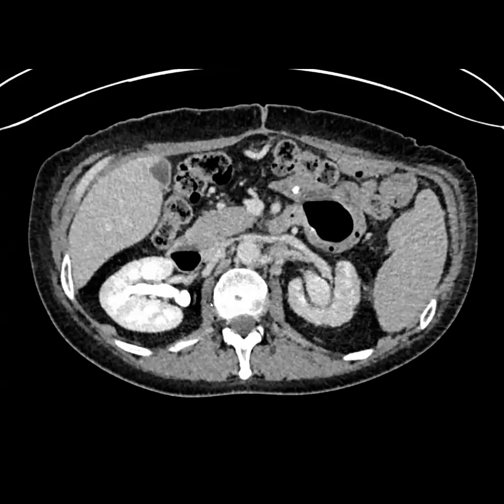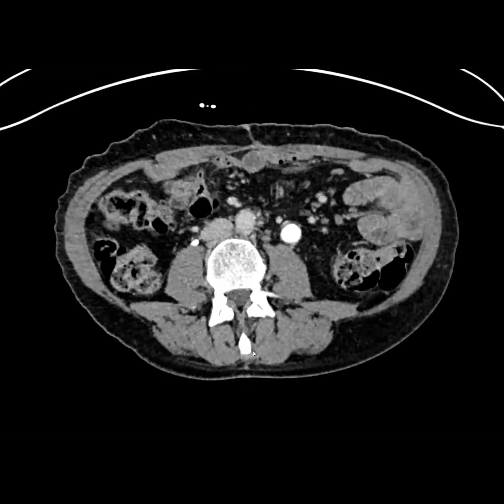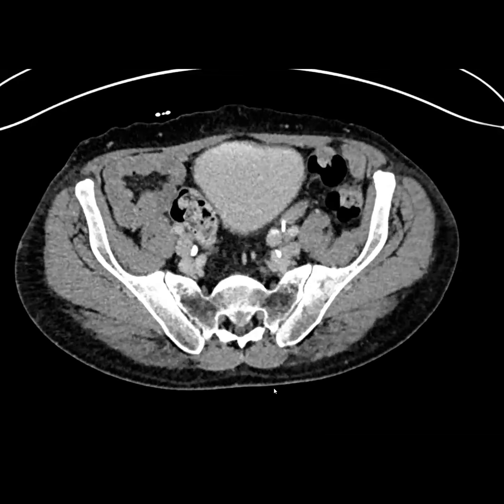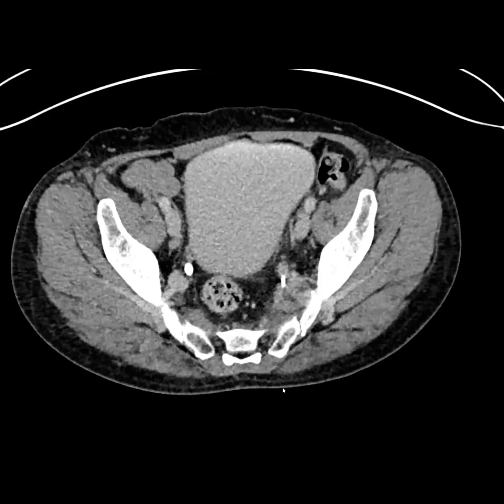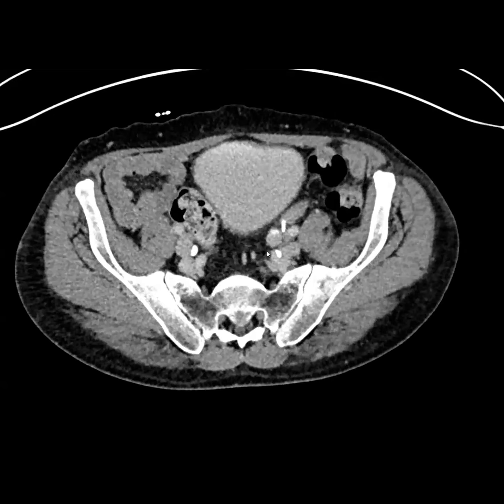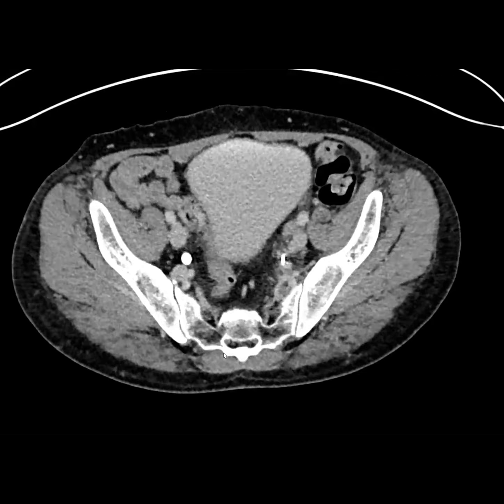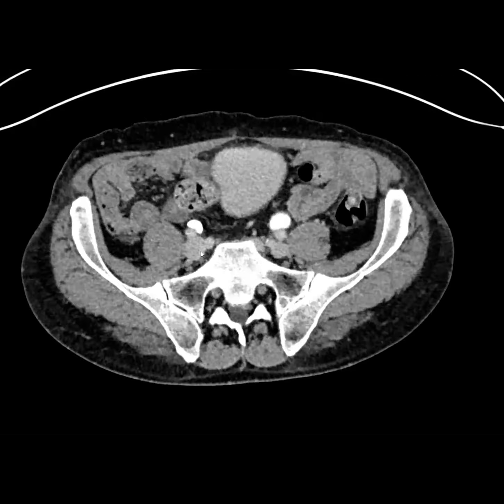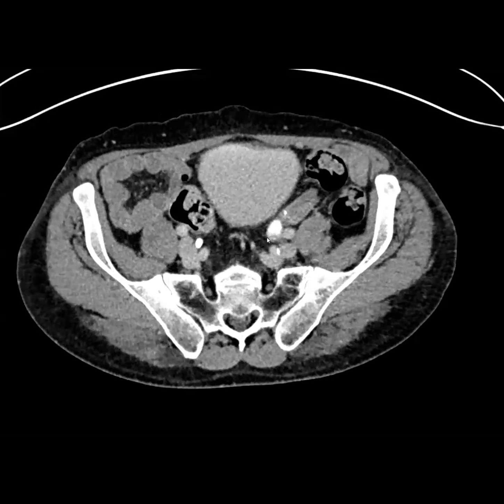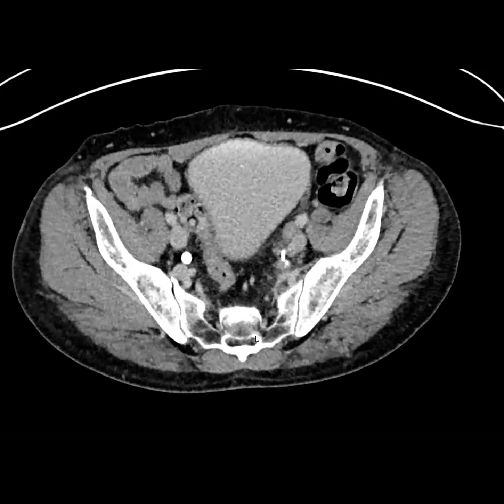Okay, this was a CT urogram, and we can see that there's some hydronephrosis on the left side. And I want somebody to point out a finding. The distal ureter has a filling defect. Has a filling defect, like right there? Or something, yeah, there's some kind of soft tissue causing obstruction, inside or outside the ureter. Okay, there was not actually a soft tissue lesion there, but that was probably the column of contrast hitting the urine. Oh. Because there is an obstruction at around that level.